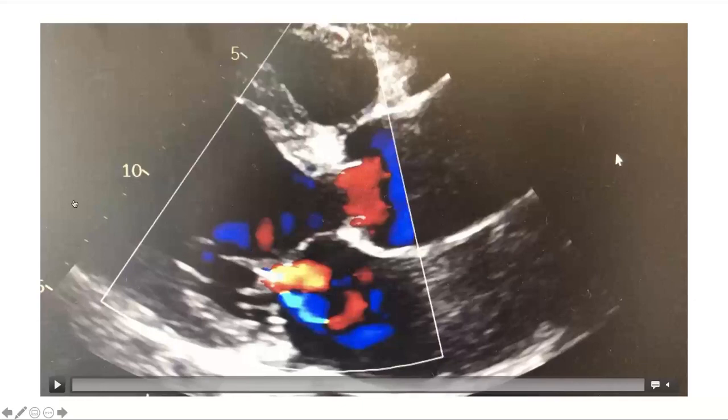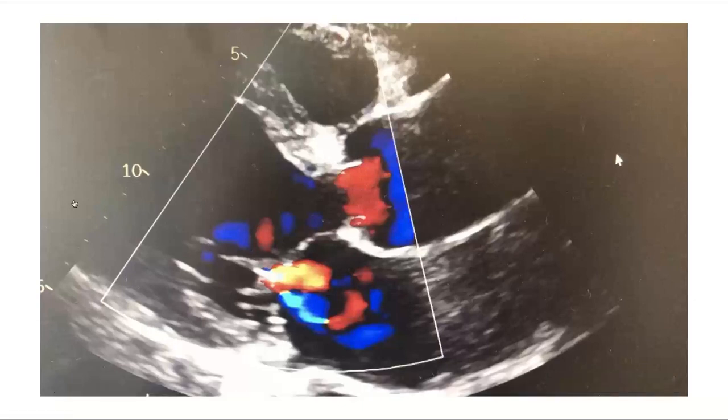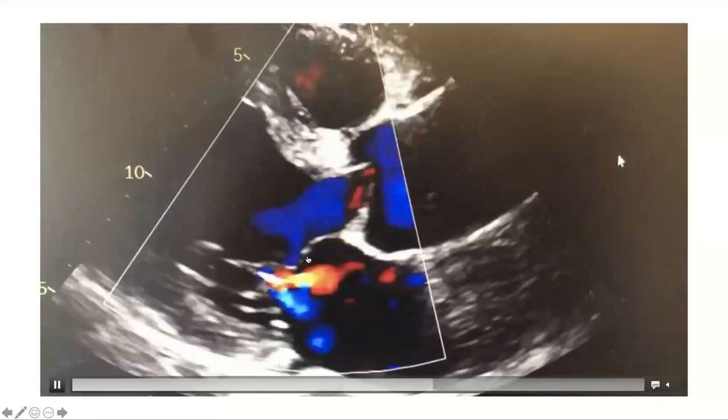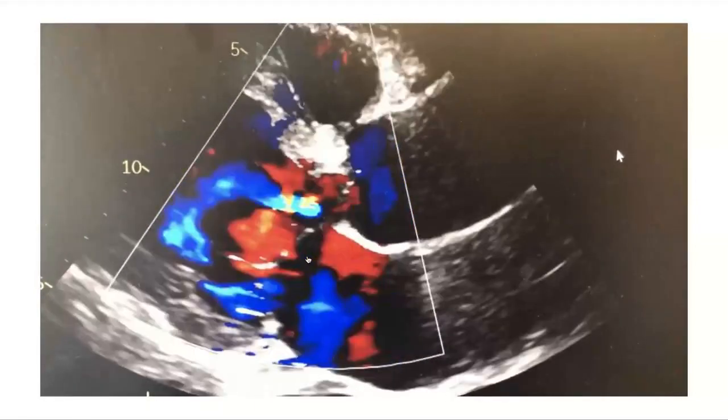In terms of this patient, the surgeons actually wanted to replace the valve, but the issue the surgeon came to the Echo Lab to speak about was that this patient ended up becoming pretty decompensated. This case actually showed early mitral valve closure with elevated EDP. So the decision was made to optimize as best as possible medically before taking him to the OR. It ends up taking multiple teams to talk about the best approach for these patients. But hopefully now we can catch them earlier and then address the issue. But that's all I have.